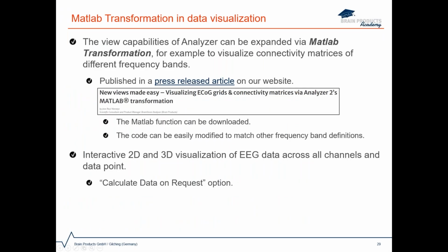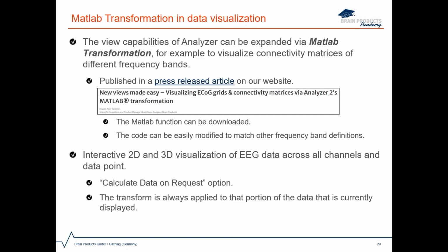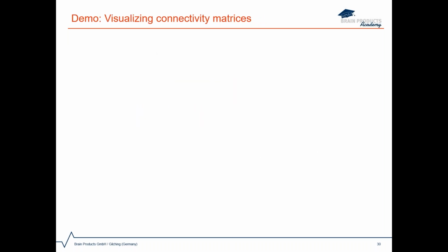In addition, I will show you how to create interactive two-dimensional as well as three-dimensional plots of EEG data across channels and data points with the calculate data on request option. With this option, the transform is always applied to the portion of the data that is currently displayed. But before going to the demonstration, let me provide you with some relevant background information.